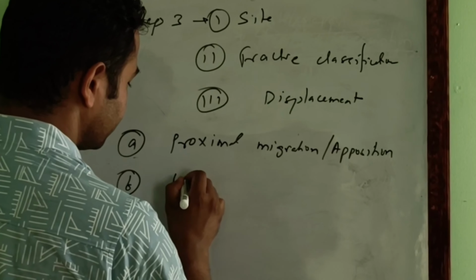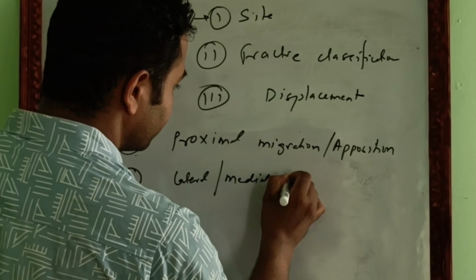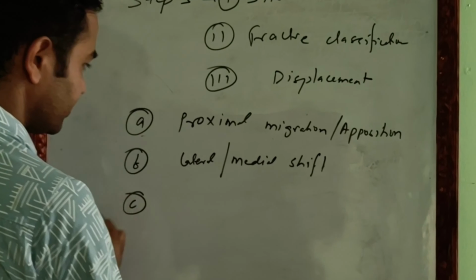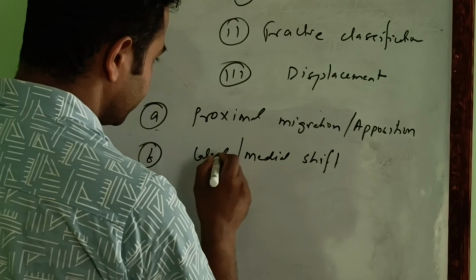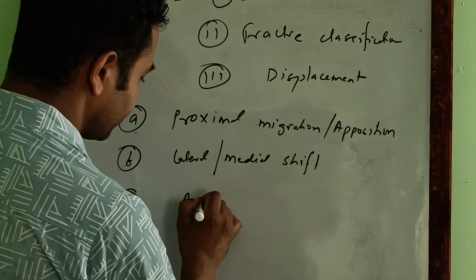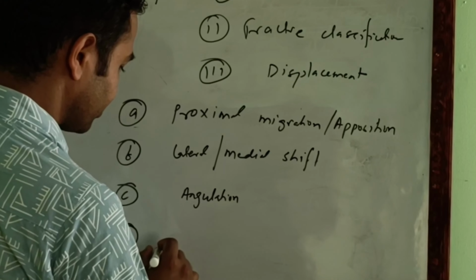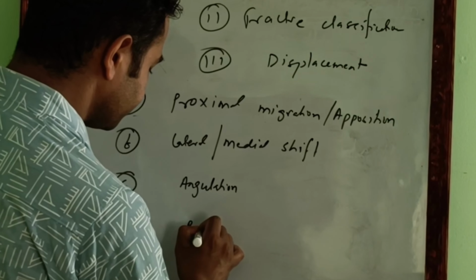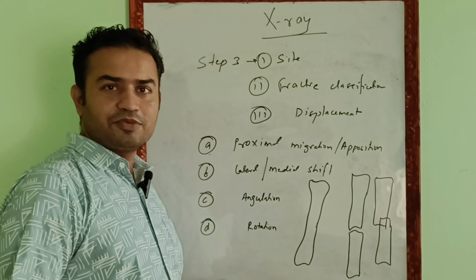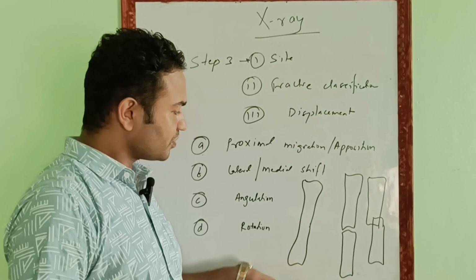Secondly, lateral or medial shift. Thirdly, angulation, and then comes the rotation.